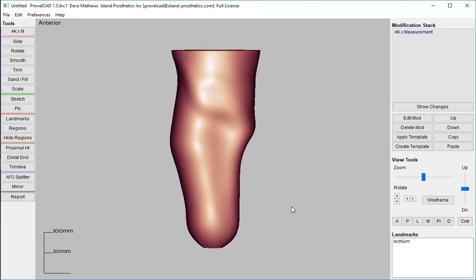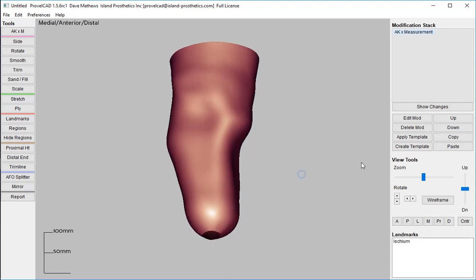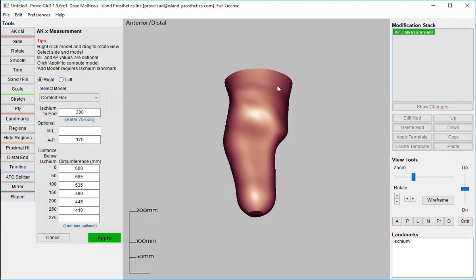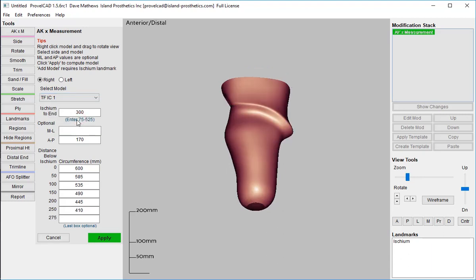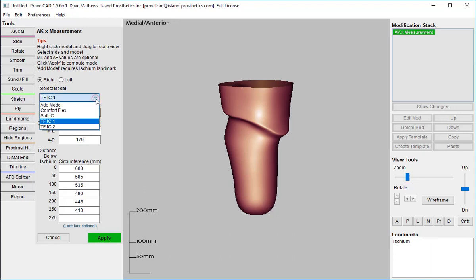Look it over. Here's where you might want to compare different brim styles. For instance, we'll double click there and pick another style. How about this one? And then go back.